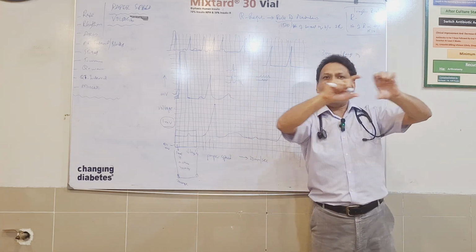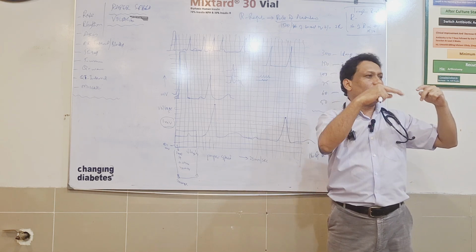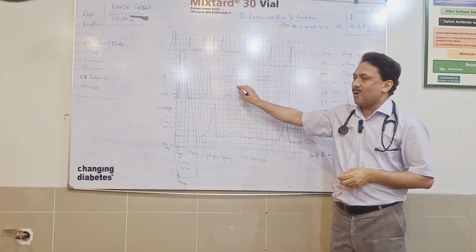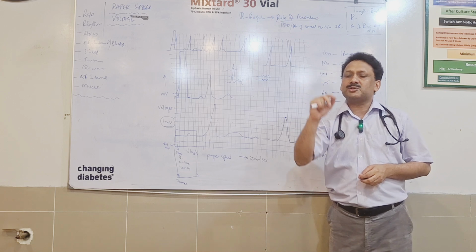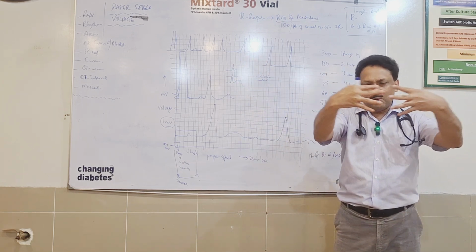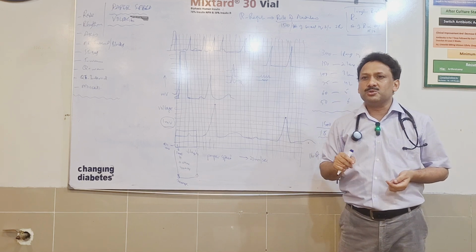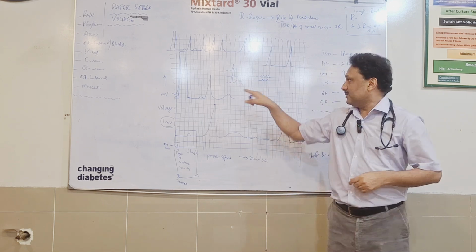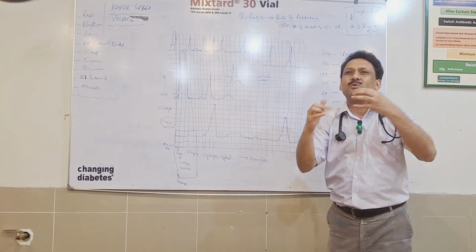There is one long strip, and then there are machines which have 3 strips or 4 strips. In a 4-strip or 3-strip machine, what can happen? If the complex is of large size, say the second line has very large complexes, they would be touching the complexes of the first line, and they will merge. You won't be able to differentiate them. So what should the machine do, so that you can clearly differentiate, this is the complex of the lower line, and this is the complex? What will the machine do? It will halve the voltage. The complexes won't intermingle.